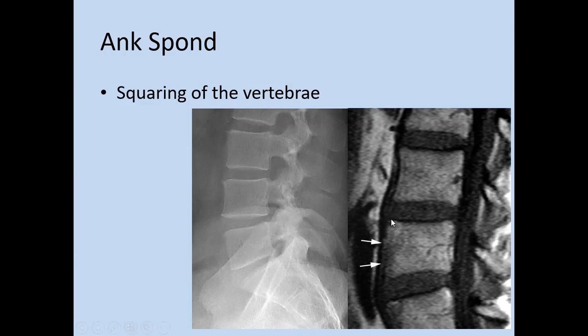And also, incidentally, here we see fatty infiltration at the corner of the vertebra, which suggests an element of enthesitis as well in the corner of the vertebra. And also in the vertebra here below, we can see features in keeping with Romanus lesion or enthesitis.